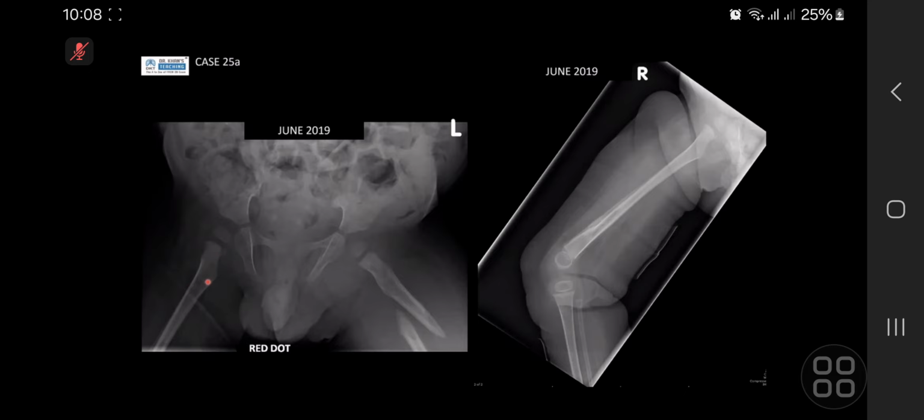I think the diaphysis is probably a bit projectional because you can see he's not quite centered, he's a bit rotated. He has periosteal reaction on the right side, and it's confirmed on the long leg views. And on the left side, yes, it's probably a more chronic fracture with periosteal reaction and signs of healing. It's displaced and quite separate from each other, which is why it's probably trying to heal but cannot heal. You can see all that soft tissue edema and swelling because of the density of the soft tissues. So something's going wrong here.